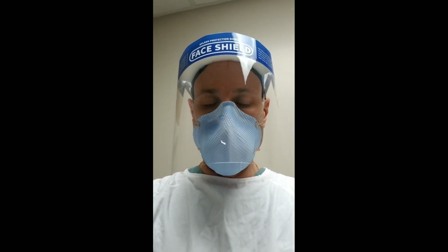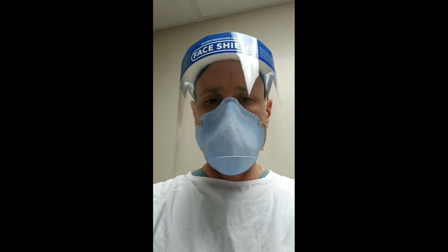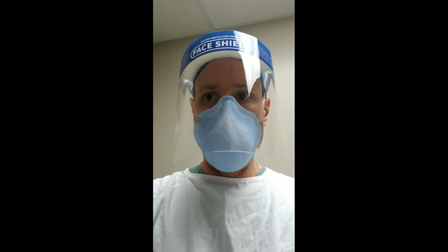The goal is usually 75. Research has shown that offers the best alveolar stability. So technically, unless there's resistance through the ET tube, the ideal PEEP should be very similar to the P low that we're going to get with the 75% expiratory release.